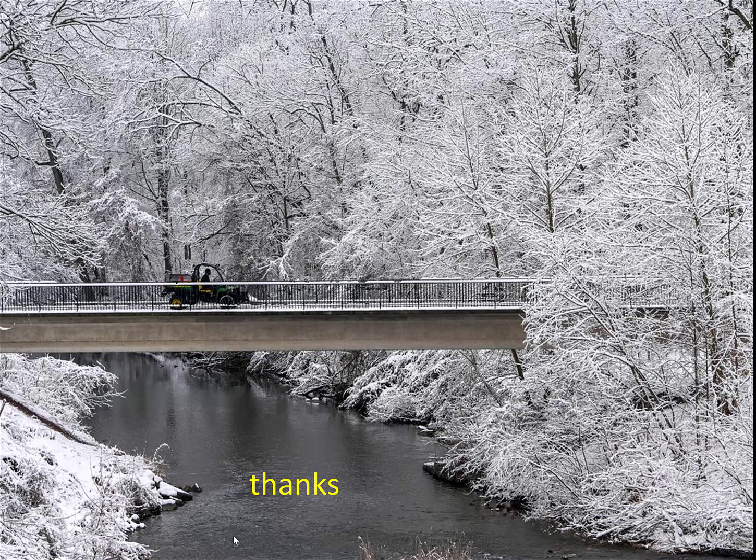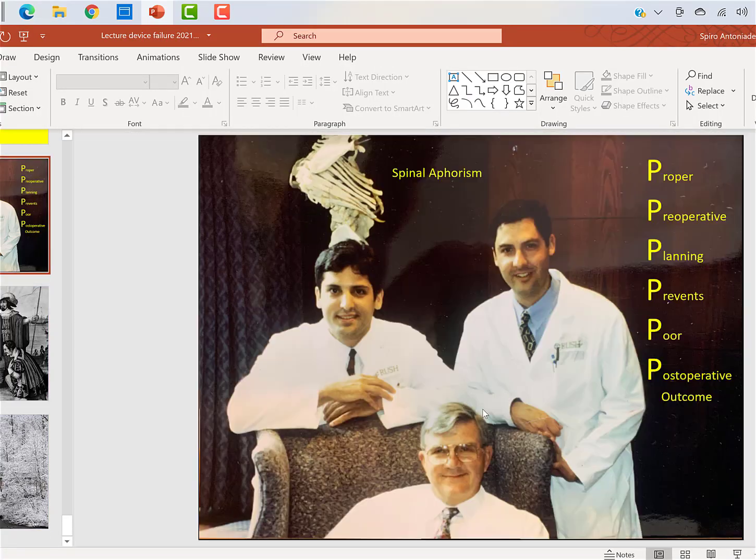No, it's just hard to know what's a good implant. You guys have a lot of different options, and a lot of it's how you're trained, your experience. Certainly high-risk people are hard to get a good result in. Heavy people, obese people, it's not surprising they get implant problems. The spine is a tough organ to fuse.